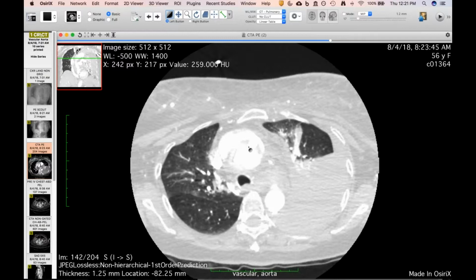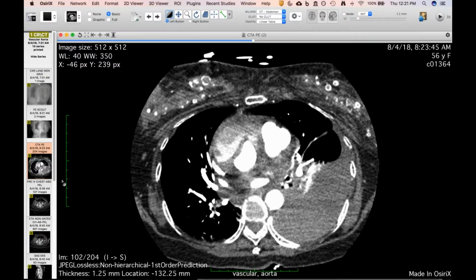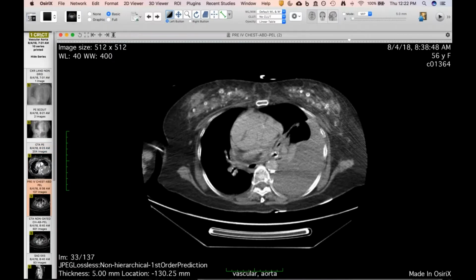on the left. But what I don't exactly know why it happened like this, but I think the surgeons were involved, and so they immediately wanted to do a dissection protocol after the PE protocol. You can see the timing here, which is not really necessary in this case.